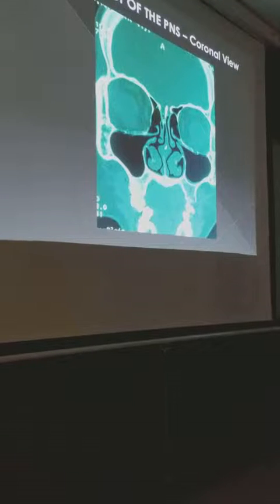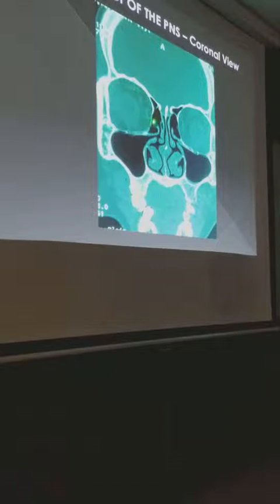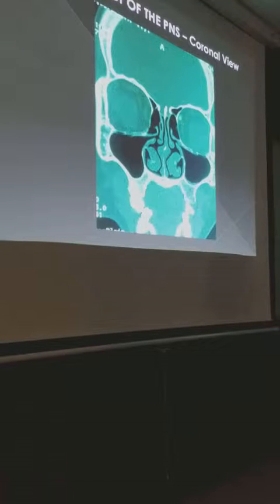So this is definitely the vertical lamella. You see that the skull base is still sharp. Okay. You have here your anterior ethmoidal bulla, hiatus semilunaris inferioris, infundibulum, and the maxillary sinus, turbinates, septum. Right? Now, suprabullar recess. Agree? Okay. So what's unique about this scan in this patient is that you see this. What is that?